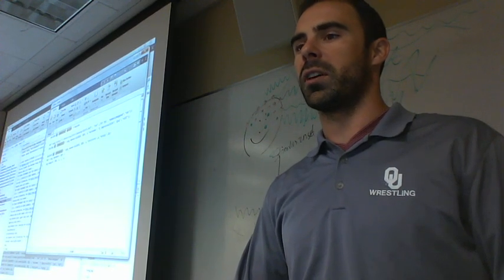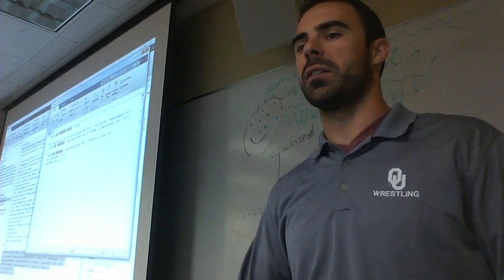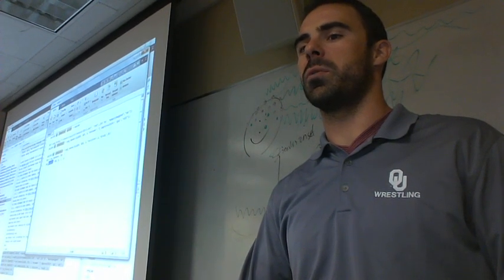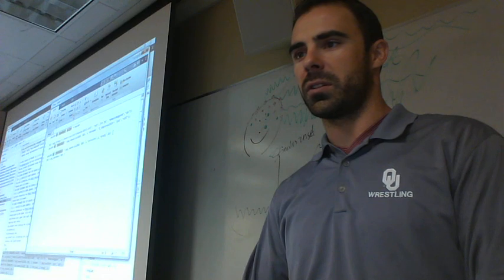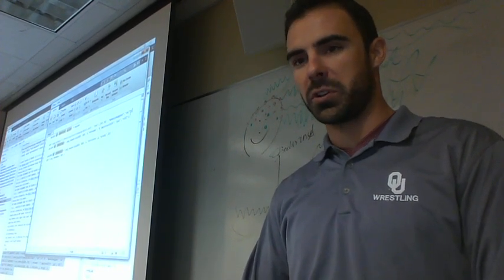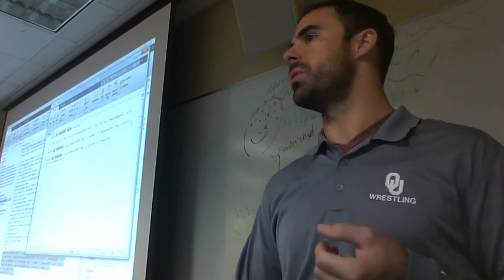What I'd like to do now is, we also plotted. Remember I said plot the EEG? So it's EEG plot, and we plotted that data. I'll just delete this because we don't need that, and I don't think I need this either. But for now, what I like to do is put spaces between it, so I can read it a little bit easier, and it reminds me what we did.